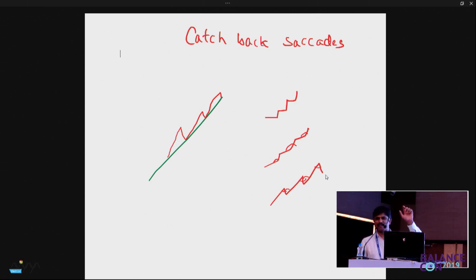So to look back on what all we did till now, we first started off identifying three alphabets: no movement, slow movement and fast movement. Slow and fast movements are relative alphabets. Then we said that every eye oscillation is not a nystagmus. So there are different kinds of eye oscillation. Jerk nystagmus is one of them. Pendular nystagmus is one of them. Then we have square wave jerks, macro square wave jerks, macrosaccadic oscillations. Then we also have ocular flutter, all these things.